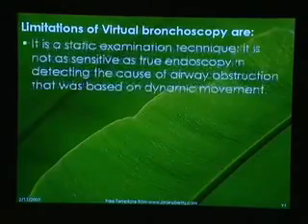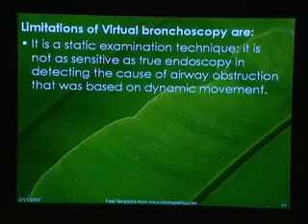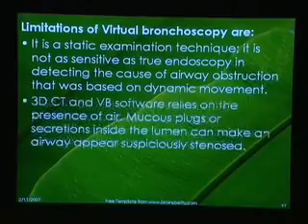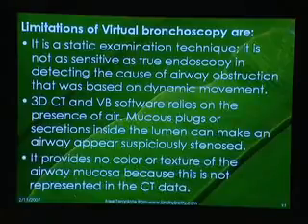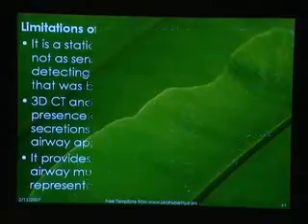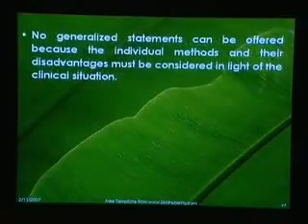So what are the limitations? It's a static examination. It's not as sensitive as true endoscopy in detecting the cause of airway obstruction when it is a dynamic cause like tracheomalacia. 3D and CT software rely on the presence of air, so mucus plugs and secretions inside the lumen can make the airway appear suspiciously stenosed. It provides no color or texture of the airway mucosa because it's not represented in the CT data.